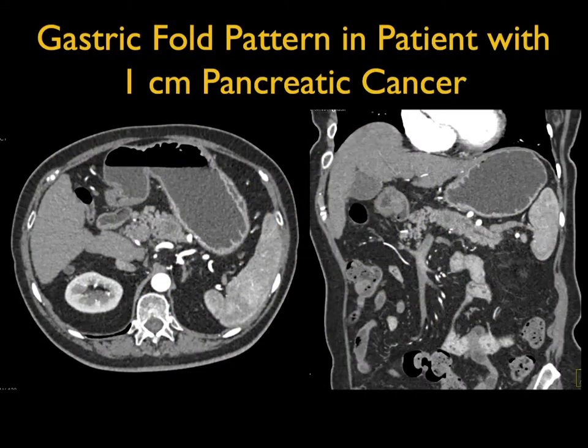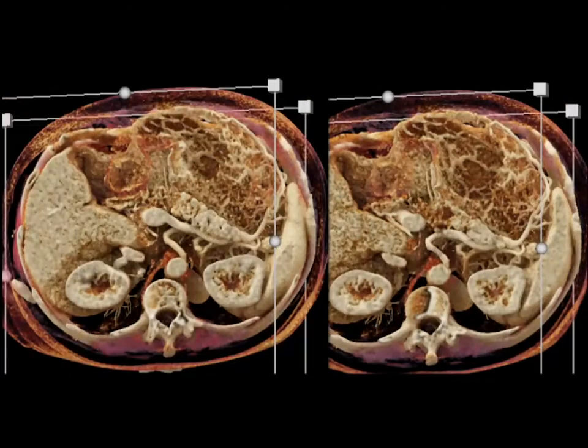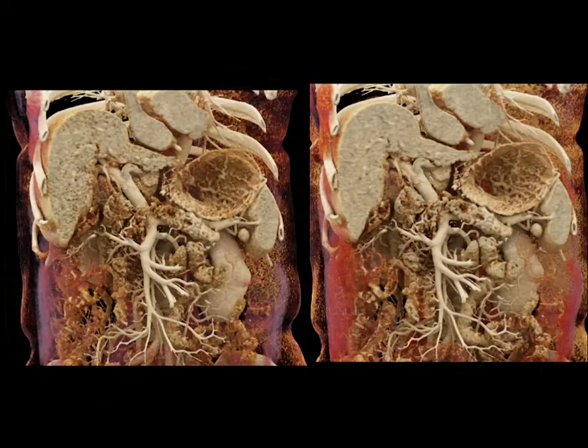And so example here, look at the patient's textural change in the stomach. Look at the gastric fold pattern. The patient also has a mass in the pancreas. And here I'm showing you the mass in the pancreas, the textural change there, as well as the fold pattern in the patient's stomach. And the prominent folds are all very, very nicely shown. And again, the rendering you do becomes very, very classic. How we control the rendering, how we control the lighting model.